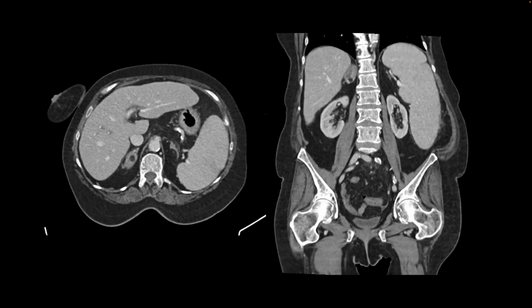This is our first patient, and here the finding is in the right adrenal. We have a hypodensity seen in an enlarged adrenal, and this finding is seen right here. Whenever there is a tumor in the adrenal that measures fat attenuation, see how it's similar here in density to the intra-abdominal fat. The diagnosis here is an adrenal myelolipoma. They have additional findings too, such as this markedly enlarged spleen.